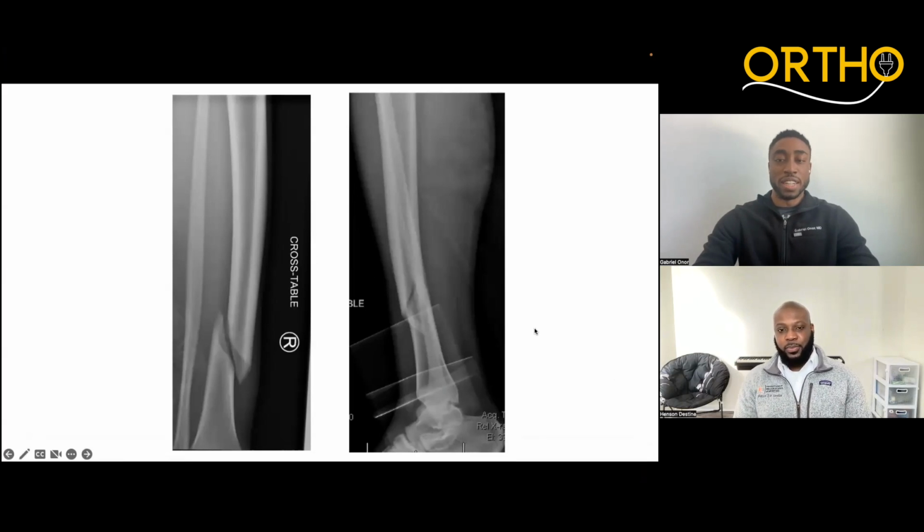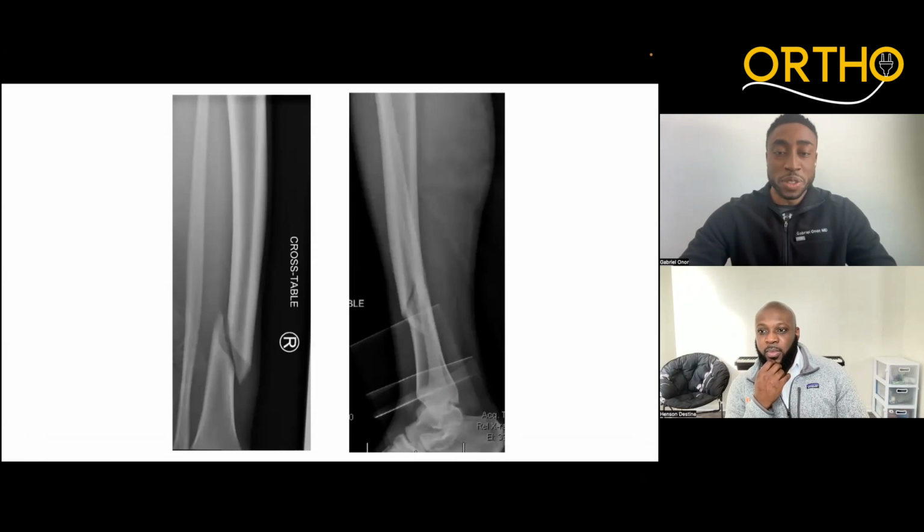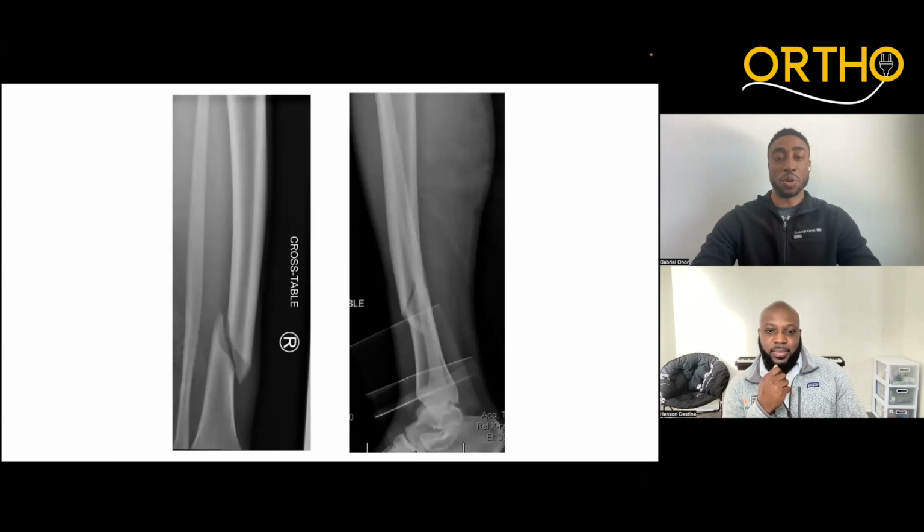Yeah, so with this one image, we might turn to the medical student and say, hey, what is this? So it's important to get your bearings, know, first of all, what bone am I looking at, and what's going on the screen. You can take a 30,000 foot view, take a step back, and stall a little bit by using a standard sequence of words.